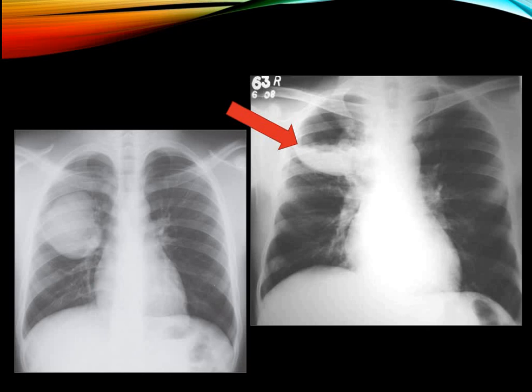As you notice, this chest X-ray contains a very large lung opacity in the right upper and middle zone, which is a lung mass, and this is mostly bronchogenic carcinoma. We should suggest a CT scan to exclude bronchogenic carcinoma. We must always remember that the chest X-ray modality has limitations, just as every test in the world has certain limits. In the chest X-ray we cannot differentiate between a soft tissue mass and a fluid one.